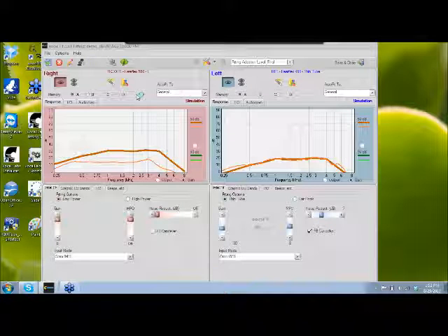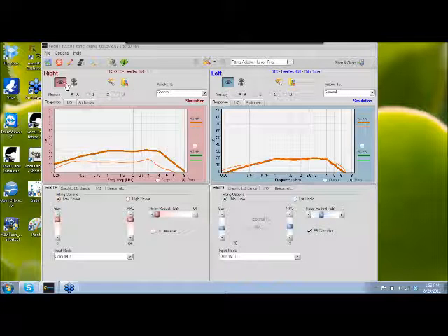When you're fitting with the Vocal Labs fitting software, it's a way that you can do a scene snapshot. And it's a way that you can jump between two specific scenes for your patient and see which one they prefer over the other. Basically what you see here is you always start out on the single eyeball. When you click on the double eyeballs, the very first time it's going to copy everything that you see down here. After that very first time when it copies it, then both scenes will run completely independently, okay?